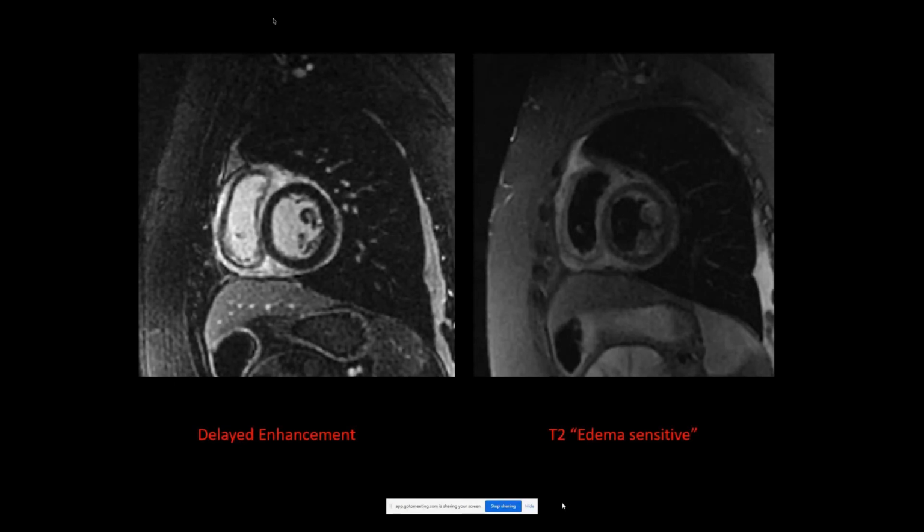Is that coming across on the images there? Yes. To me, it was the most striking thing I've ever seen, and it was a fairly consistent finding. So we were really excited to try to correlate this with acute cellular or humoral rejection patterns, or maybe something else like lymphocytic infiltrates that they call Quilty lesions.